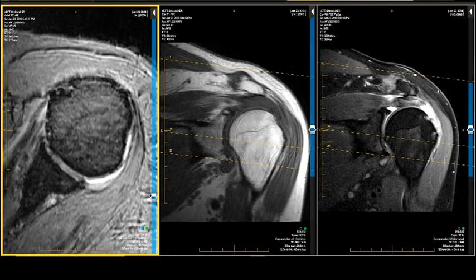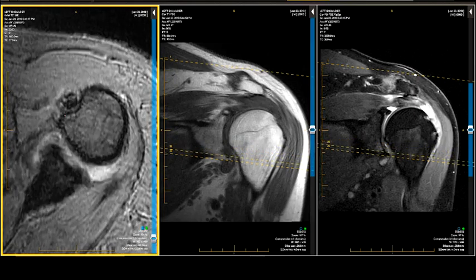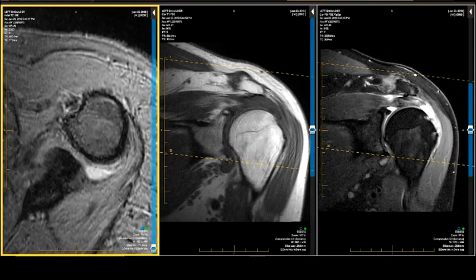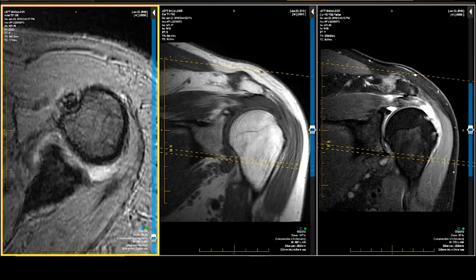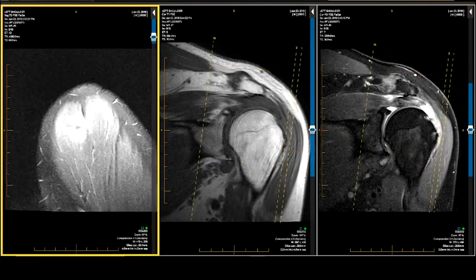Now look at the subscap detachment here. That should be over here on the lesser tuberosity, tightly attached with the MGHL, which did attach. That's the MGHL, which travels with the subscap. The SGHL travels with the biceps. So as we go down, the biceps looks a little irregular and a lot sicker, but we've got bigger fish to fry. Let's pull down the sagittal.